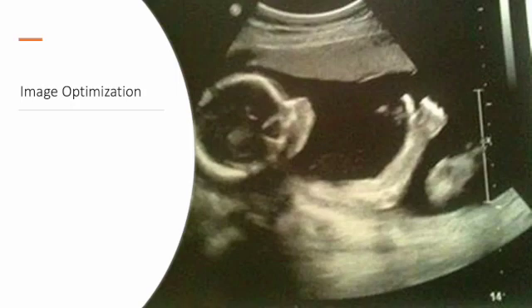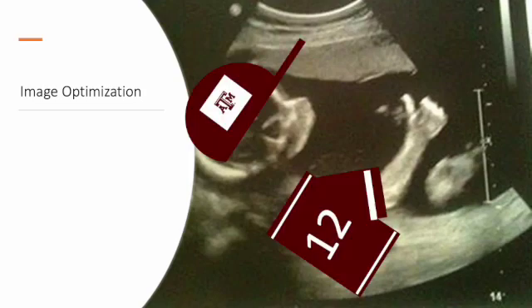Image optimization refers to all of these steps that we've talked about, plus a few more, to make the best image possible. And if you look at this picture, you see a baby giving us the thumbs up, and you're like, wow, how could this image be optimized? And I tell you that as an Aggie, that's how you do it. Get going.